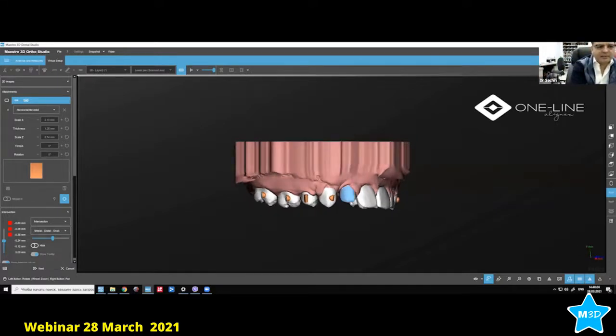So let's see if this is a tooth which is tipped mesially, let's say. This has 2 problems. One, it's a very small tooth, which is not good. The good part here is that it has enough surface area on the mesial and the distal part, which is very good. So you have to get the movement done, which means that you need movements here mesially, here distally. Let's see what options we have for attachments to get such a movement.